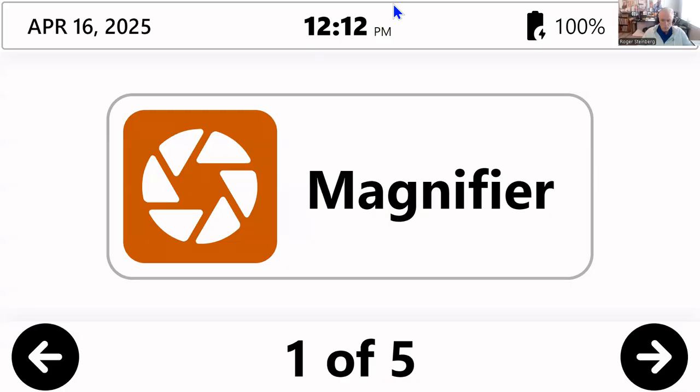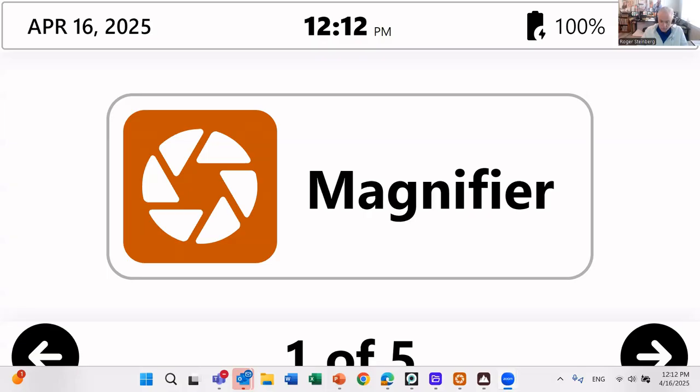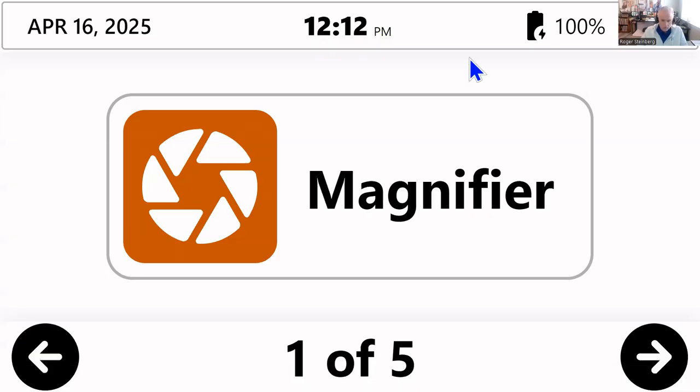So if someone can tell me through the chat if you are seeing the Prodigy software in your window there. So let me get my chat open again. It closed on me. Okay, great. Thank you, Brady. So I have my software opened up down here, and we are in what's called the carousel.